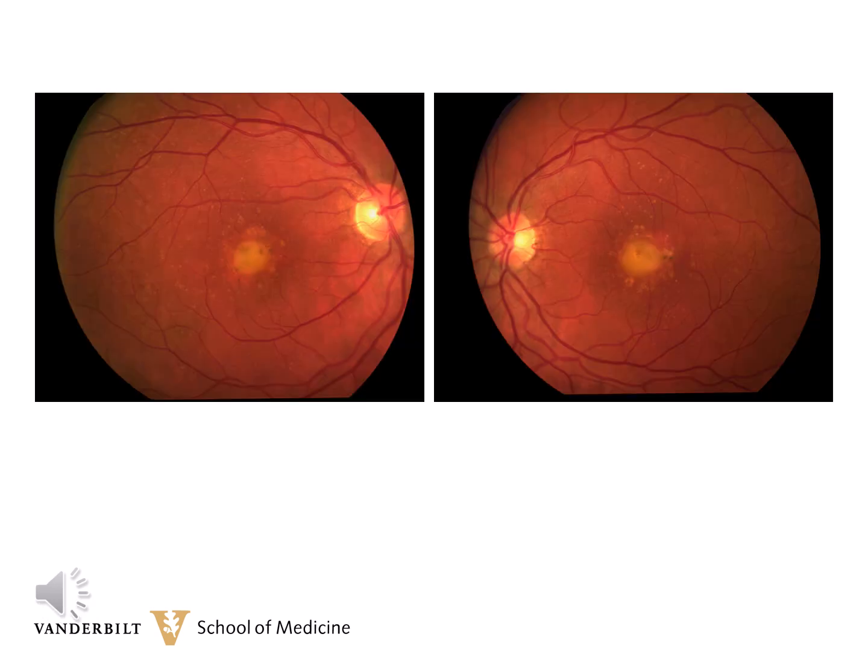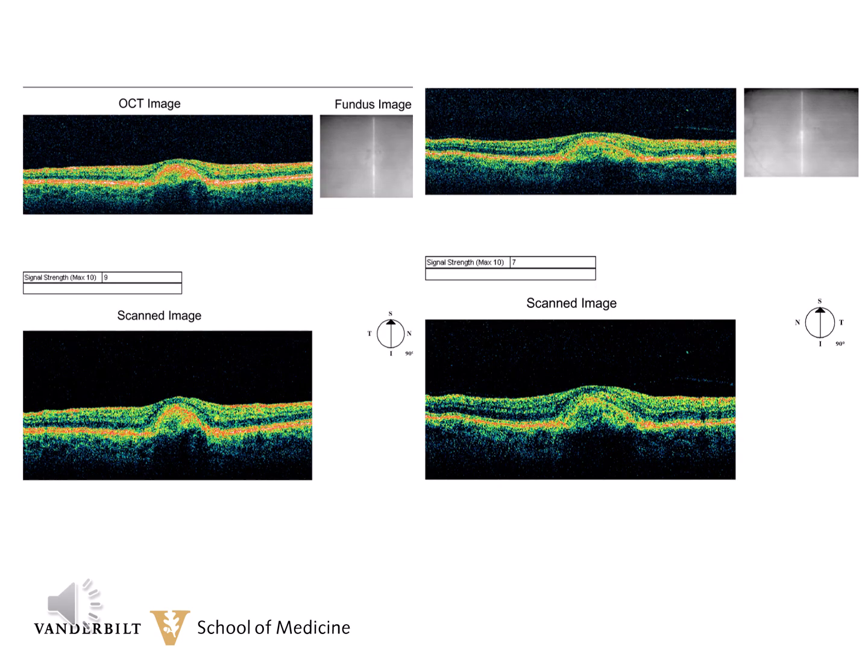This is one of my patients who is a 63-year-old female, and she was referred to me with a diagnosis of age-related macular degeneration. She'd had blurred vision in both eyes for several years, and the vision was 20/60 in both eyes. You can see the central vitelliform lesion and some faint drusen scattered throughout the macula. Here is her OCT, and both eyes show the typical pattern of type 1 pattern dystrophy.